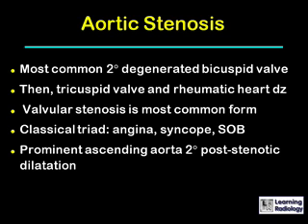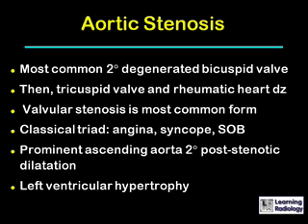On a chest radiograph, we may see a prominent ascending aorta secondary to post-stenotic dilatation from the turbulent flow and the eddy currents. There should be left ventricular hypertrophy, which may not cause cardiac enlargement until the heart begins to decompensate.